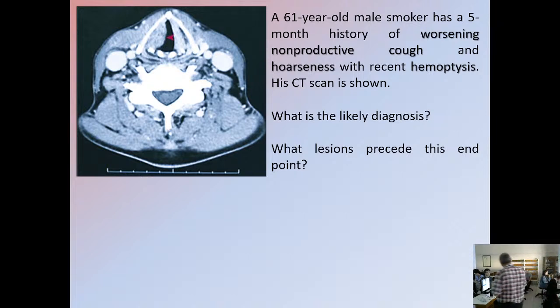And it's very important when you see an invasive tumor to look at the neighboring normal lining epithelium. If it is dysplastic, it is a sign that it derives from this epithelium. If it's totally normal, it's not so possible. It might be something arising from deeper epithelial structures, such as salivary glands.